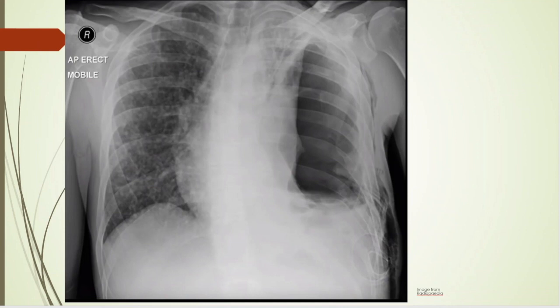All right, so here is an interesting, really interesting chest x-ray. Let's start off, looks like this is the trachea here. It's kind of difficult to see, but it almost looks like it comes down here. I can't really see. This may be the bifurcation, but that seems to be up kind of high. So anyway, let's go into B for bones. Ribs look okay.